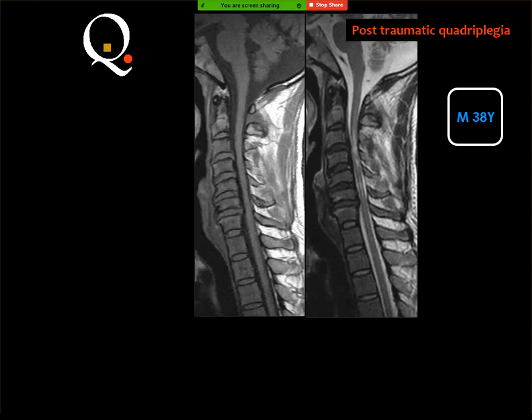And what do you think of this? Cervical MRI, T1 and T2. Yeah. Straightening. Yes. And multiple decrease of the bone height. No, this is myelomalacia. Myelomalacia. Okay. Abnormal bright signal on the T2 image. Do you feel that this spinal canal is normal? No, there is herniation between the. Yes, but there is edema of the.